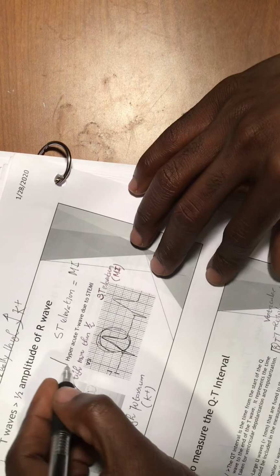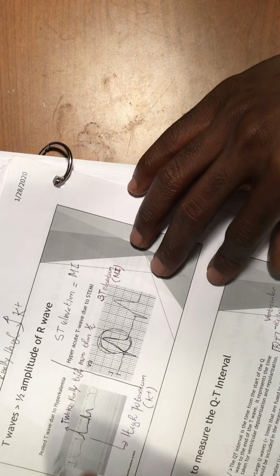As I was saying before, you can have T elevation, but you need to make the difference between T elevation and ST elevation. When you have a T elevation, you're going to have only the T wave higher than it's supposed to be, but you would still see your S, because you have your QRS. But when you have ST elevation, the S and the T kind of look the same, and they go upright. This is so important. They are really high and greater than 1 millimeter. Okay, but let's keep going.